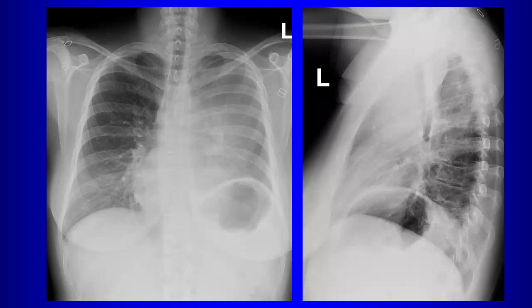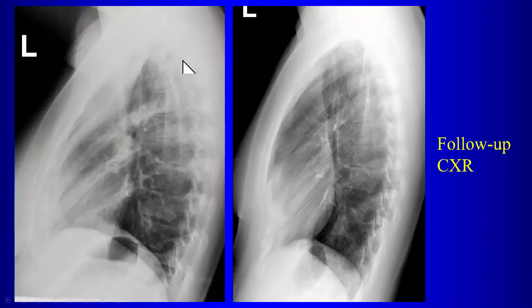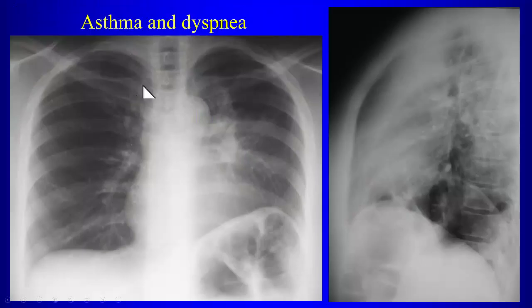Do we notice anything different? So look carefully at the lateral view. Do we notice anything? You're talking like the Luftsichel sign? Well, what sign are you talking about? The Luftsichel sign is a sign of left upper lobe collapse, okay, but that's not what we see here in the lateral view. And remember the prior cases of left upper lobe collapse I showed you, right? You can see what the collapsed lung looks like here, right? See it there in the lateral view?